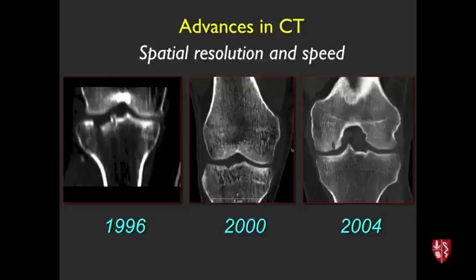And then we had what's called spiral helical CT with thinner slices and better reformations, and even better, more detectors, thinner slices. So these might be like 0.5 millimeter slices all stacked up in the coronal plane. So it can create images in almost an arbitrary plane now with about the same amount of radiation, but with much faster acquisition. And this is even a decade ago. Things are faster and thinner slices than that now, but similar quality.